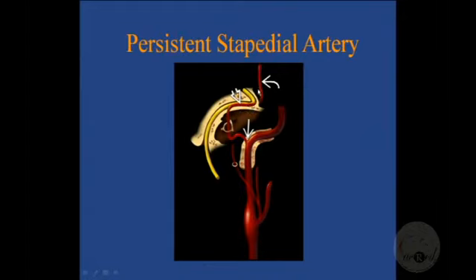So can you all hear me, okay. So it runs along the tympanic segment for a short course, somewhere from here to the genu, and then the labyrinthine segment is clean. And then it runs into the intracranial segment as the middle meningeal artery. So that's the anatomy of the persistent stapedial artery.